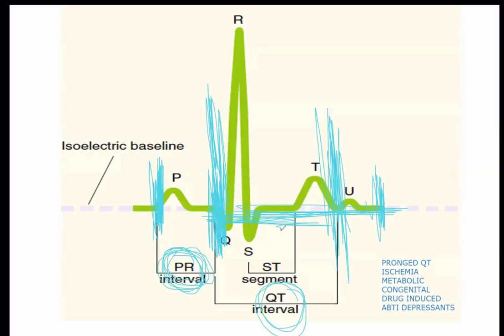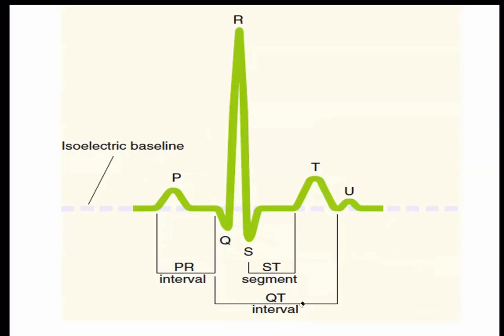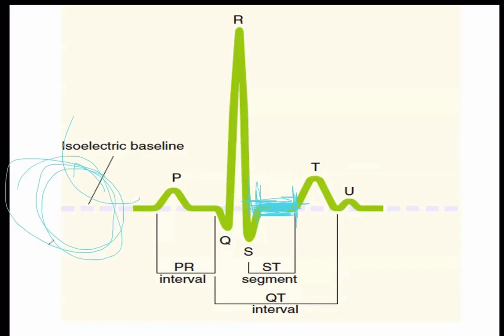Now we come to the most important part of our talk, which is the ST segment. Where is the ST segment? This is the ST segment, the one I am highlighting. In any ECG, I should compare the ST segment to the baseline ECG before the P wave, in order to see if the ST is elevated or depressed.